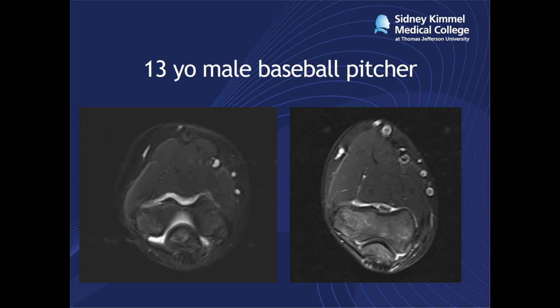This particular situation, when you have a displaced cartilage fragment like that, is a surgical case. They can try to reattach or anchor this osteochondral fragment back down, but if that's not possible, they may have to do a graft. In less severe cases, where you may have just a small amount of edema in the subchondral bone, not actually fragmentation or undermining fluid, those lower grade lesions where it's just edema may be managed conservatively and just see how they do. But a situation like this needs to be addressed surgically.